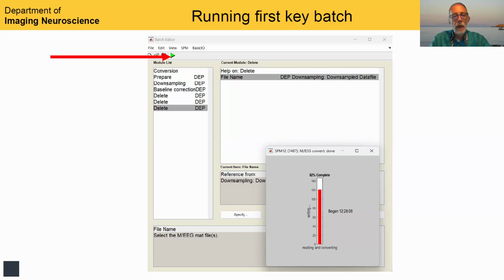Again, these things don't take very long for this demonstration, just a couple of minutes. You can start that if you want, and let it cook while you watch my next bit of the talk.